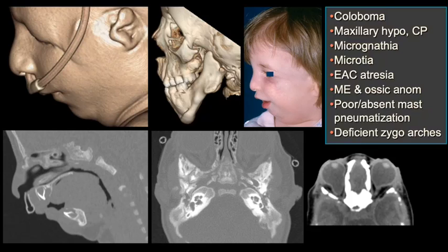Now let's look at an example. Bilateral micrognathia, down-slanting palpebral fissures, the rather posteriorly slanted malar eminences, microtia, the small mandible has a very obtuse angle over here, and there's deficiency of the condyle. Notice also this defect in the zygomatic arch, very characteristic of Treacher Collins syndrome.